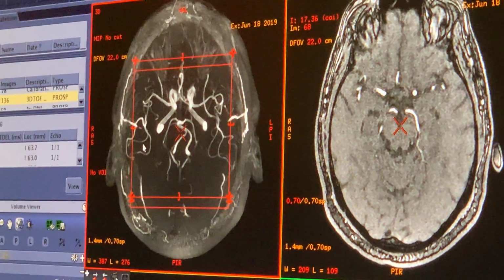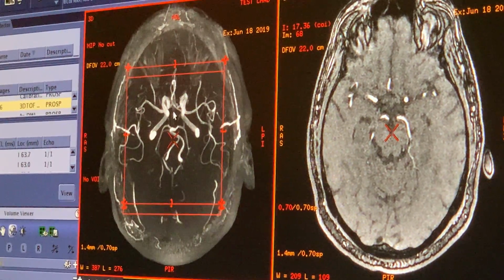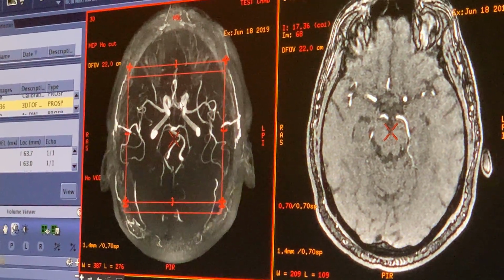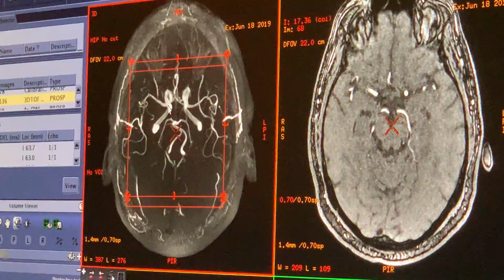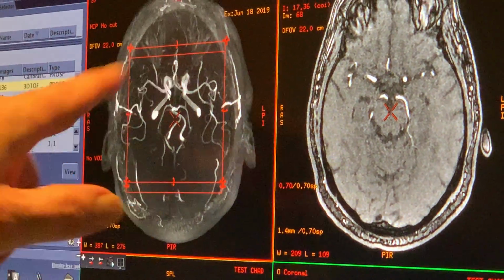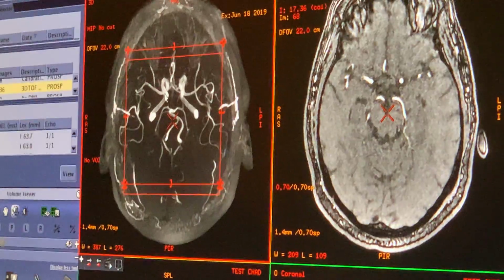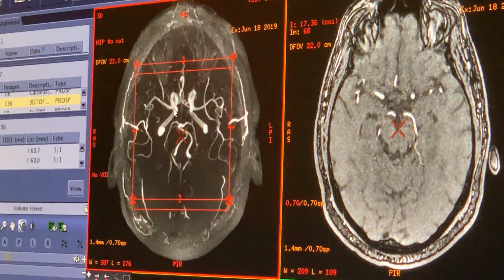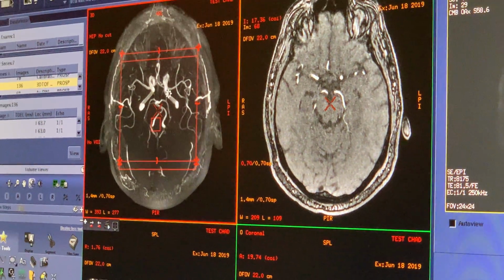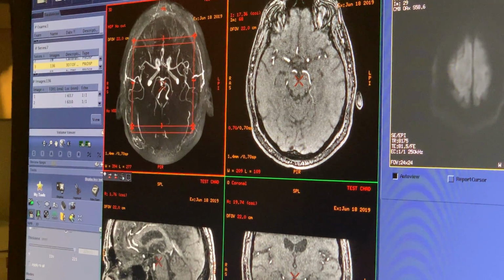You have one anterior communicating artery, but you can never see it because the two anterior cerebral arteries come together from the left and the right side, and they just turn into a mess right here. But in that mess, there should be a communicating artery between those two, creating a circle right there. So if one of these arteries gets blocked, then blood is shunted from another artery to keep a stroke from happening. That's the design feature of the human brain. But not everybody has these. Some people are born without communicating arteries.